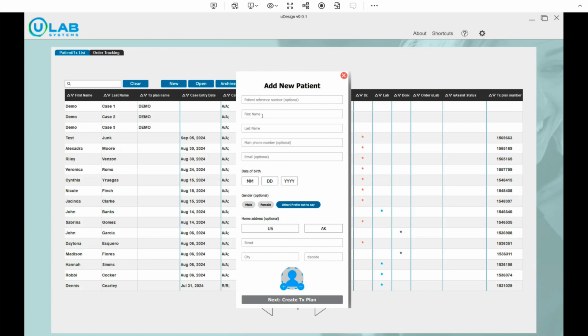The required fields are first and last name and date. Anything other than that is just, we don't need it. You'll see me trying to skip the date of birth, but it's needed. I usually just pick a fake date.